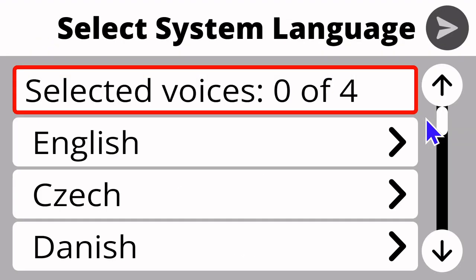Process takes about 3 minutes in total. What you saw happening was the magnification app, the distance app, the files app, the books app all downloading. Prodigy restarted itself. Then we downloaded some OCR and installed that, downloaded text to speech and OCR samples and installed both of those. So again, it took about 3 minutes to get through that process there. I sped it up for the sake of our video.